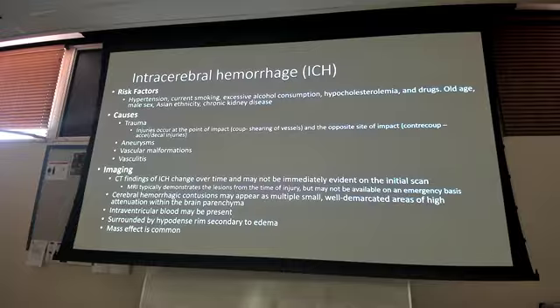You may have blood inside the ventricles, okay? And then that mass effect, that's what that pushing of the objects is. Mass effect is common in most of these bleeds. The mass is affecting the ventricles and pushing things over.